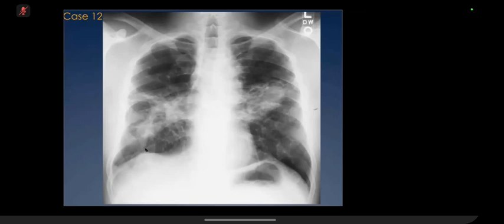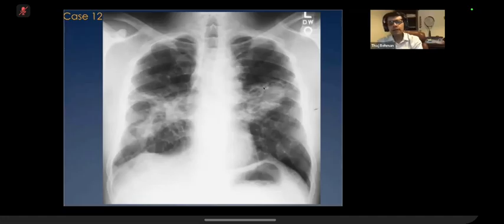The cavities, the fungal ball can develop into previously formed cavities from tuberculosis, but here tuberculosis are typically upper lobes. The other differential would be vasculitis cavities, and then patients immunocompromised, and then developing these mycetomas in them. Right. This is sarcoid cavities with fungal balls. Okay. If you see cavities in the center, think about sarcoidosis.